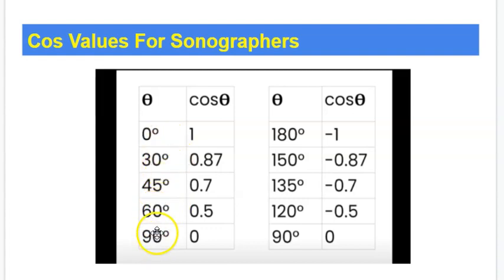30, and 90. And if you're doing vascular ultrasound, 60 degrees is where you land. That's about the best you can get in vascular ultrasound. That's exactly a 50% drop-off. And the machine knows that, so it adjusts for that setting.